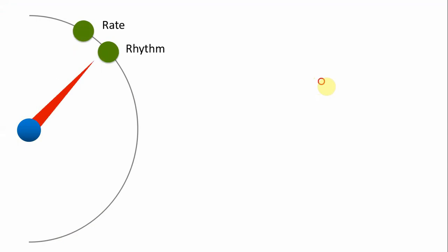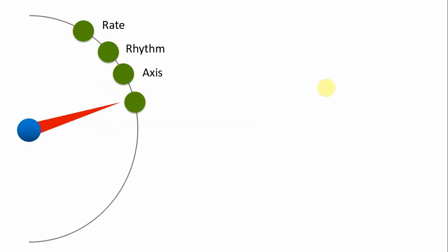Right, so let's do a quick summary of this. So first of all, when we look at the ECG, make sure that this is the right patient. Look at the rate. Once you are happy with the rate, then we look at the rhythm. So make sure that the rhythm is regular or irregular. Is there a sinus rhythm? And after we're happy with the rhythm, we look at the axis. Is it normal axis between -30 to +90, or is it a right axis deviation or left axis deviation?